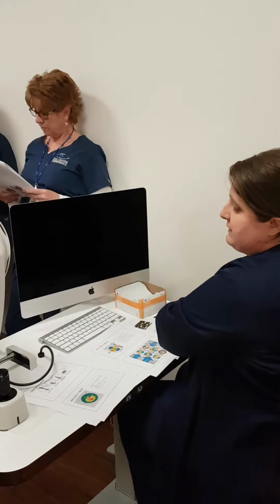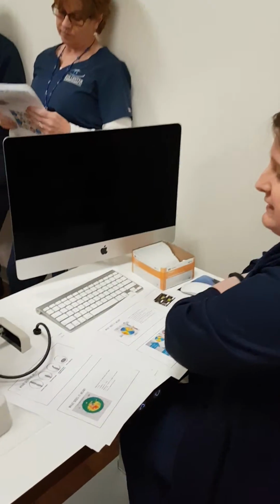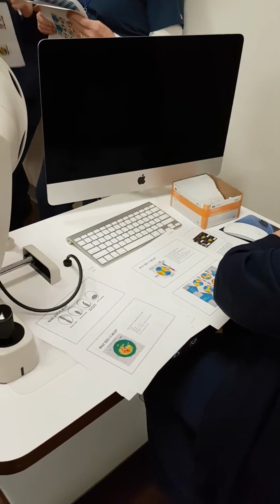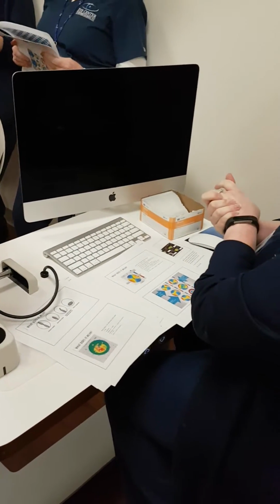Obviously the regular one is the symmetric bow tie. Right next to it, the middle two, the asymmetric bow tie and the skewed one are both pretty common to see. I should caution though, these 2 patterns can happen if the patient's off center.